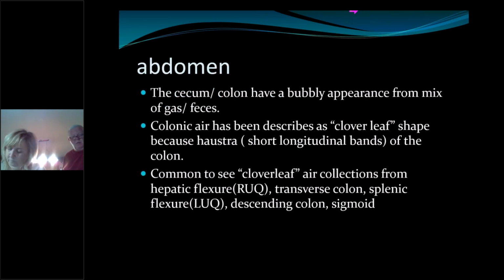In the cecum, typically the colon itself will have more of a bubbly appearance from the mixture of stool and gas. Colonic air has been described as a clover leaf shape because of these short haustra or longitudinal bands.